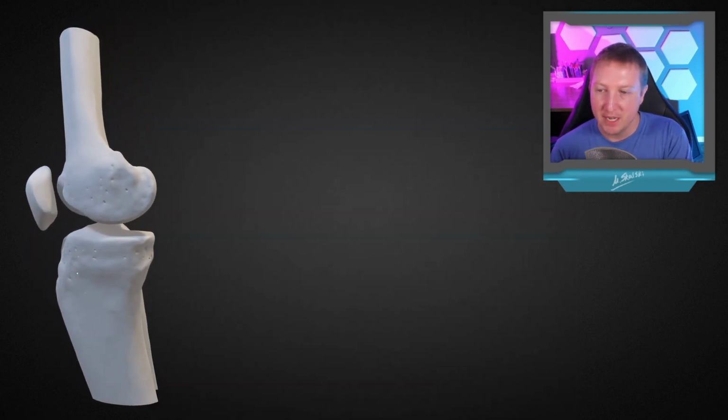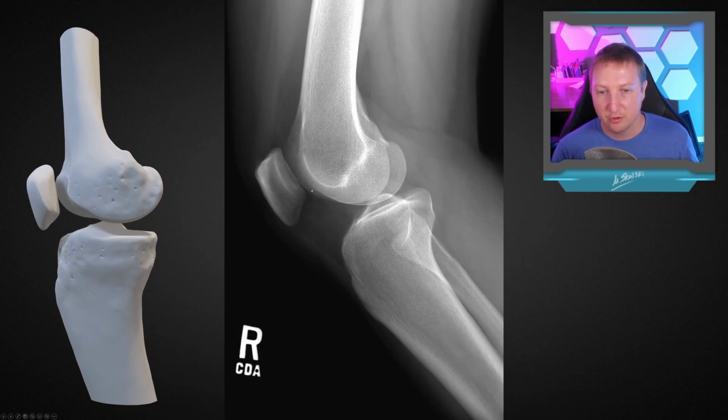All right, so let's look at a slightly oblique lateral knee. And I actually don't even mind when I get a little bit of obliquity in my lateral knees, because it does sometimes make it a little bit easier to separate out the medial and lateral condyles. And again here, we can see our medial condyle projecting a bit more posteriorly, and then we can see our adductor tubercle and then our gastroc attachment up here as well.